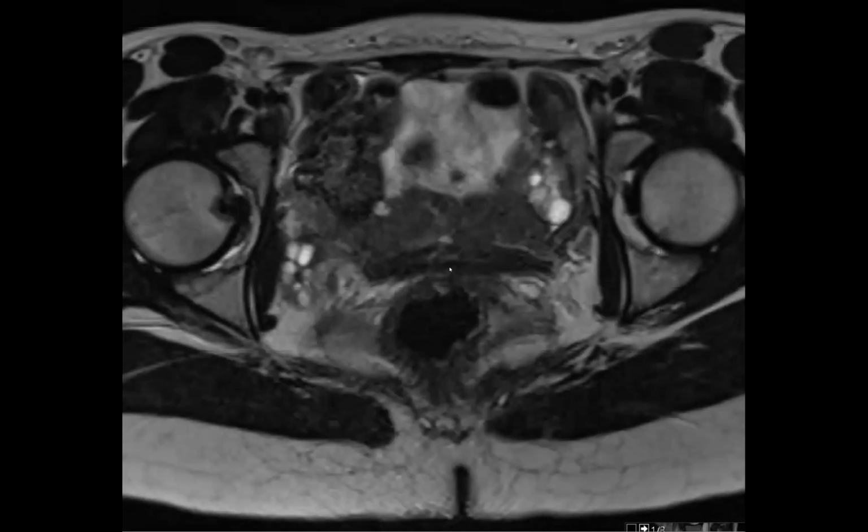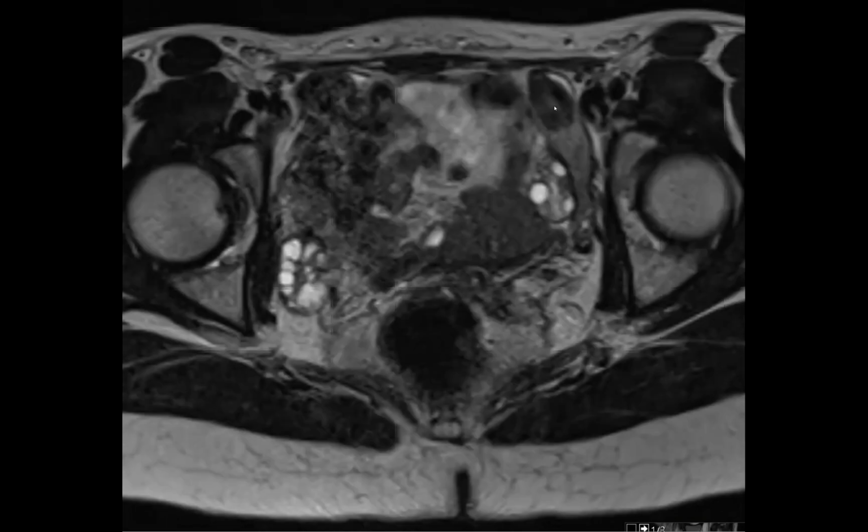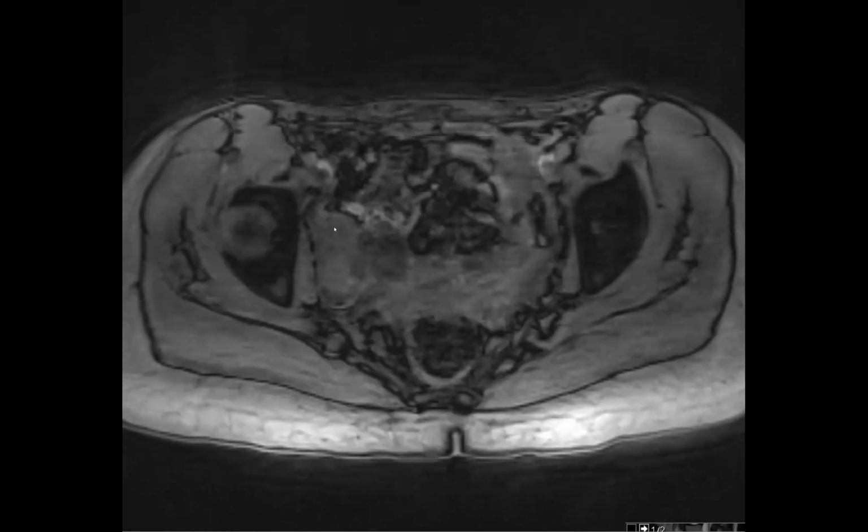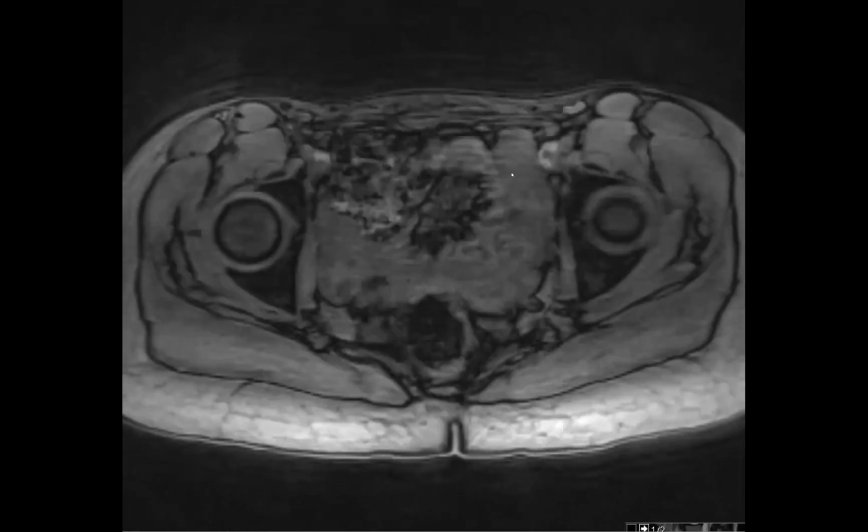And one thing we want to look for is to see if we think there's functional endometrium. And in this case, we thought there was functional endometrium because of this bright signal here that looks like a normal endometrium. But one thing you can look for also on T1 pre is to see if there's any blood in there, to say, oh, it's actually menstruating and making blood that's not able to leave because of the lack of development.